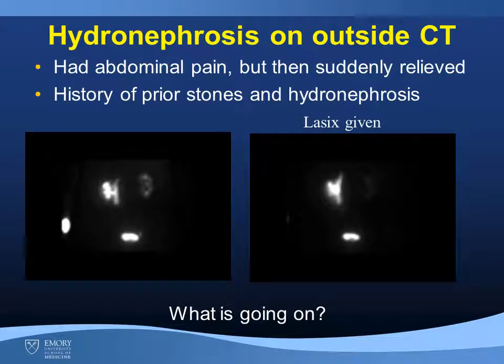And we could see that while there is good uptake and excretion and emptying on the right, something strange is happening on the left. Lasix was then given, and we could see something really strange is going on. So what do we think is going on?